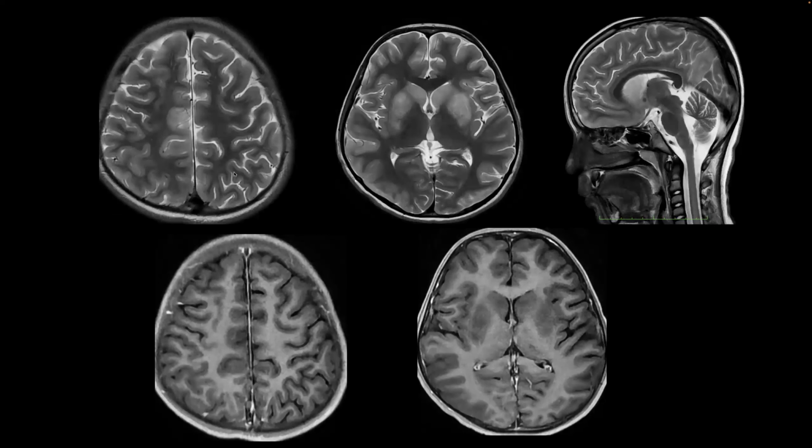T2-weighted sequences again demonstrate the edematous changes, now predominantly in the bilateral basal ganglia, slightly asymmetrical, right more than left. But yeah, there was no contrast enhancement, and I can say that there was no hemorrhagic components or calcific components in these regions.